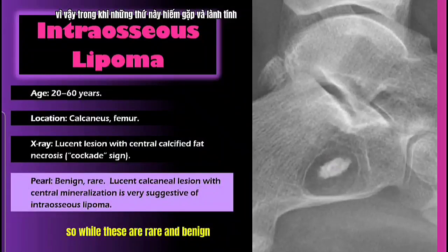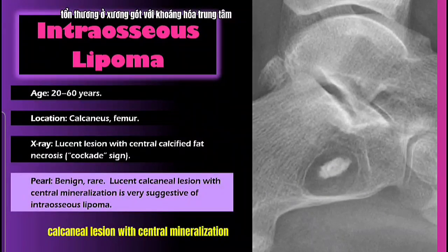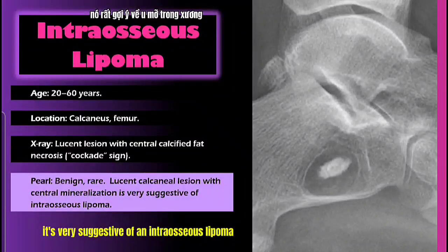So while these are rare and benign, if you ever see a lucent calcaneal lesion with central mineralization, it's very suggestive of an intraosseous lipoma.